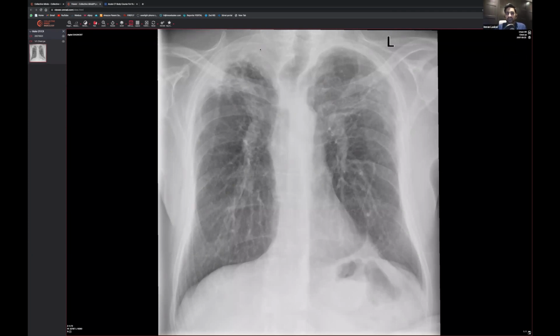So you can see here, where are the hilar? The hilar should really be around here, shouldn't they, in your average person? But these look like they've gone upwards. So that's a bit of a clue. And someone said it perfectly well. Look at that hemidiaphragm. That one's all the way straight like so, but this one kind of tents upwards. Can you see that? It's like a little tent.